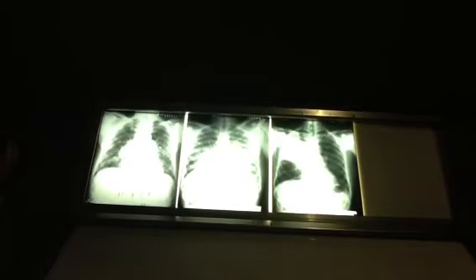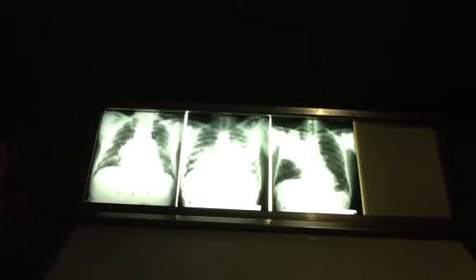If the nodule is between 3 and 5 millimeters, I believe he puts that in the interstitial nodular category. I don't remember, because I use a different millimeter. I don't go into such detail. But I'll show you something.